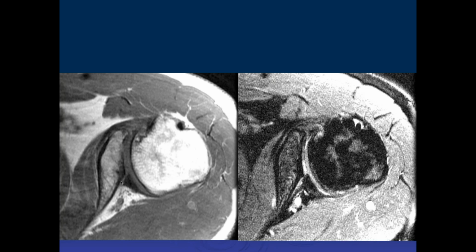You're talking about this? I don't think it's through the glenoid, but here we go, right through here. Just a tiny. Okay, so here's the glenoid, right here. Okay, what's this? Right. That's a labral tear.